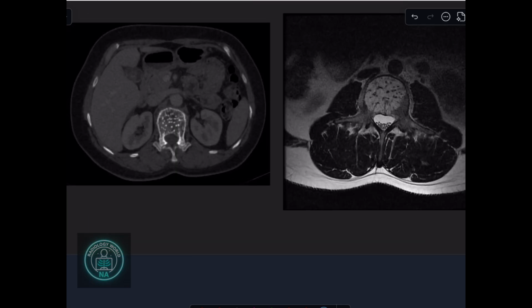So again, this is very important. Salt and pepper is also seen in vertebral hemangiomas. Okay, so remember, this is also called the polka dot sign. If you see the sagittal images, they will have a jail bar or a corduroy appearance, whereas if you take the axial sections, they will give you either a polka dot appearance, or a salt and pepper appearance.